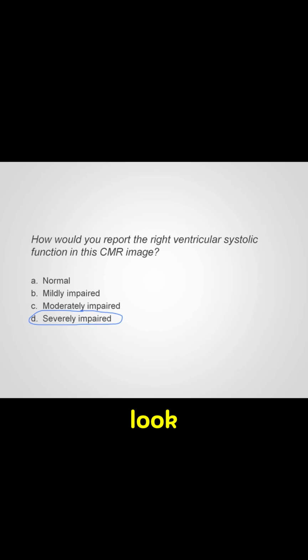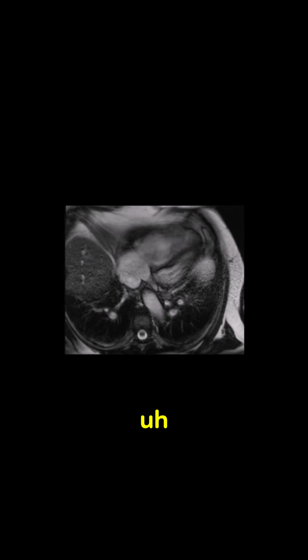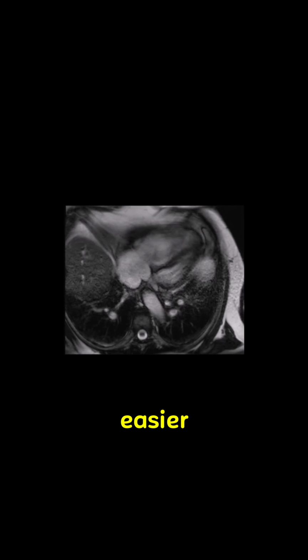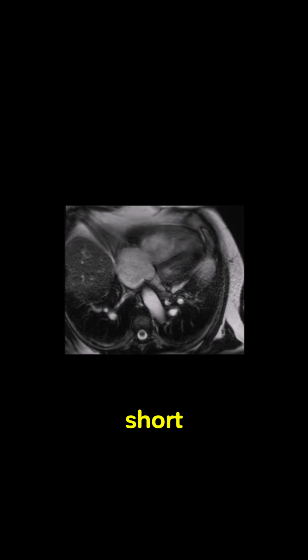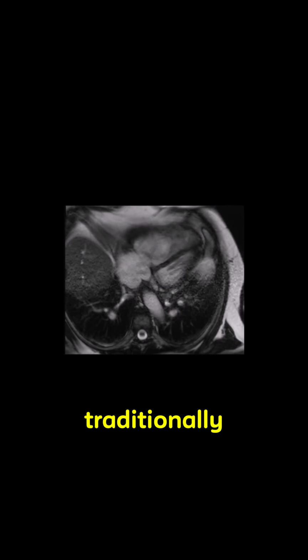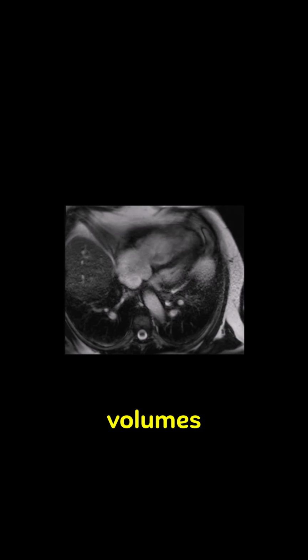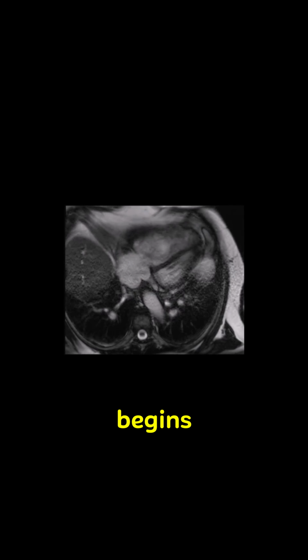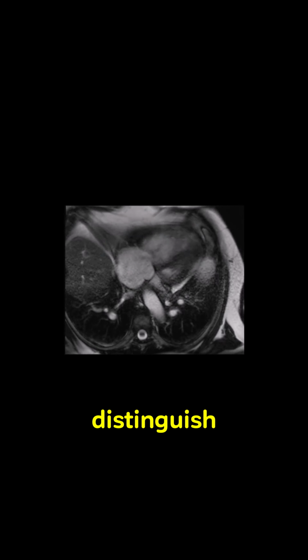Let's take another look. So this is a true axial view of the right ventricle. It's a slightly unusual view that we use occasionally to make it slightly easier for us to measure right ventricular volumes. When we perform a short axis stack, which is what we traditionally use to measure left and right ventricular volumes, it can be difficult to determine from that where the right ventricle ends and where the right atrium begins. The area around the tricuspid valve can be quite tricky to distinguish.